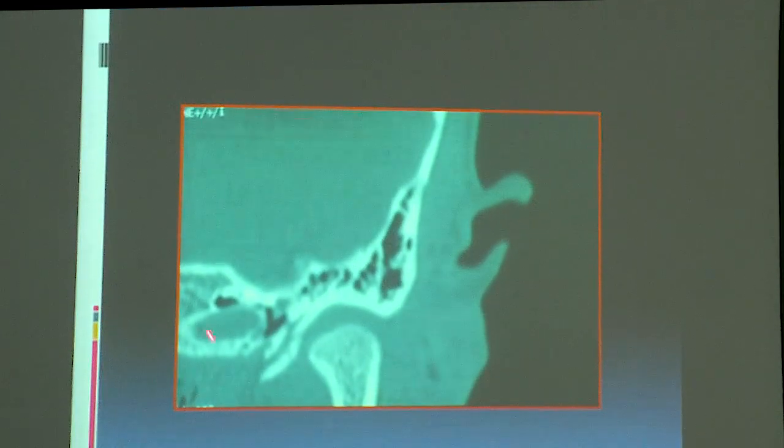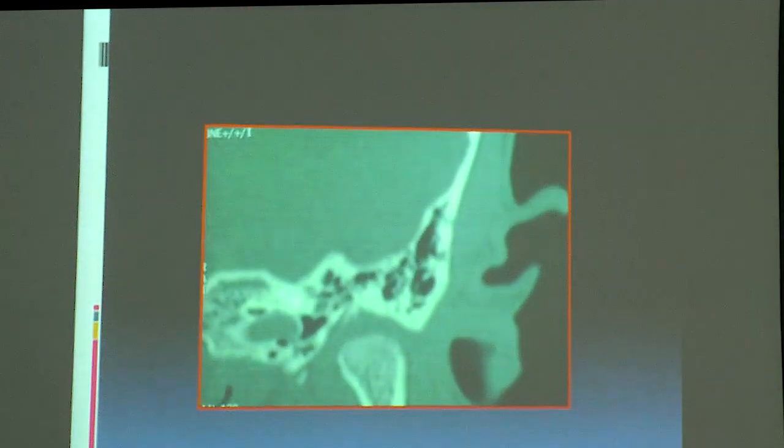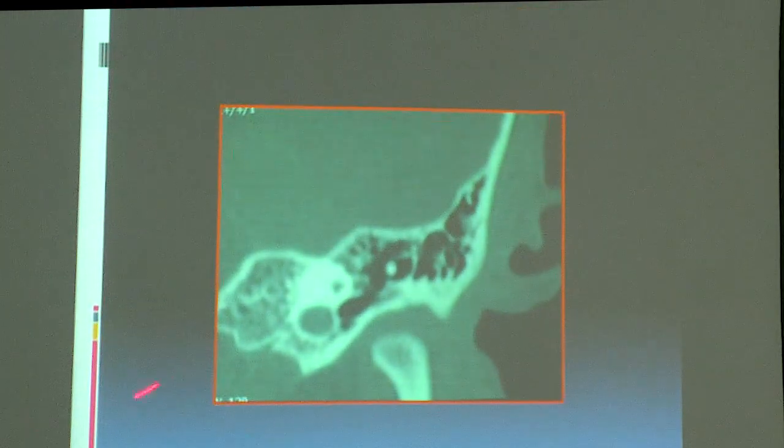So we are starting here. So this is the horizontal carotid and this is the tensor tympani muscle, right? We go back, we see the tensor tympani muscle here and we just see a small white grey dot within the white bone. So that is the GSPN coming forward. Okay. We go further back and it becomes a bit wider. So it is the geniculate ganglion region. This is the thing and it has moved up as well.